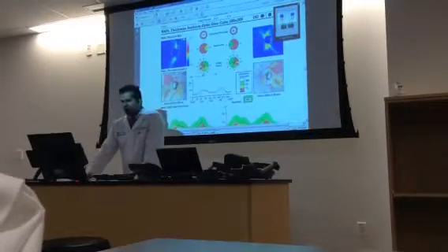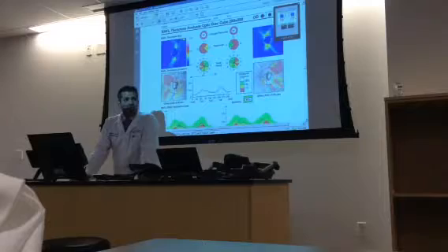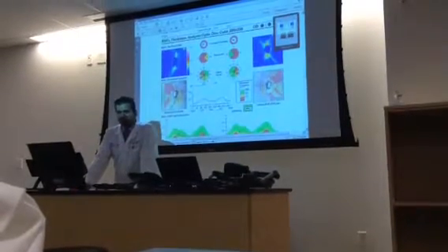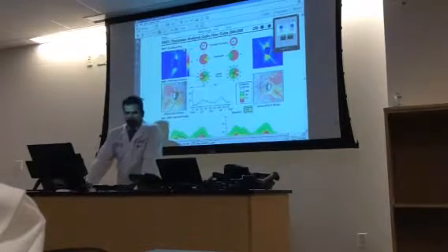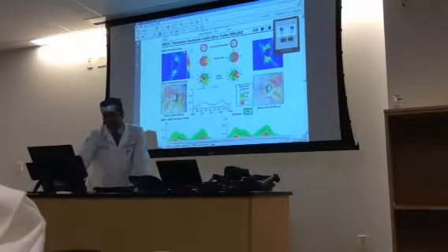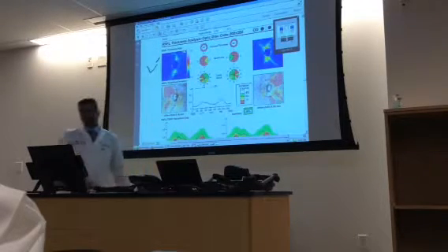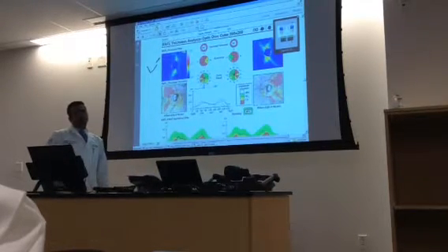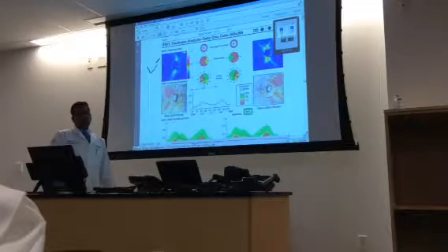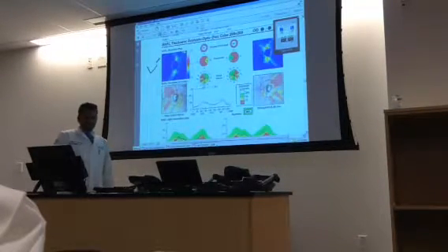Okay, so what do you think the retinal nerve fiber layer thickness map tells you? Jimmy, top right here, what do you think this tells you? Can't tell from pointing. You can't tell where I'm pointing. Okay, let's use the pen. What do you think this tells you? It tells me the retinal nerve fiber layer right around the optic nerve is not very thick. Good.